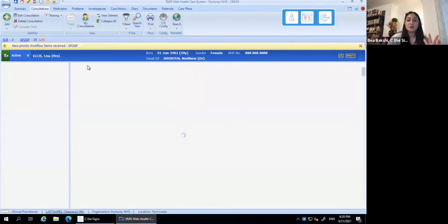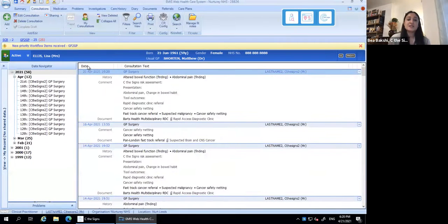Just to say that I spent a lot of time obviously talking through the different options. In real life, when you get used to the system and you know that you're going to go straight, say, into the gynae section or the chest section, it's a lot quicker, where you just click a couple of buttons for signs or symptoms or risk factors you're worried about, and then click next, and then it's done. Same way, if you want to access referral forms very quickly, within a couple of clicks, you can get to the referral form and then complete that. So in a real life environment, it is a lot quicker, obviously slower because I'm talking you through.